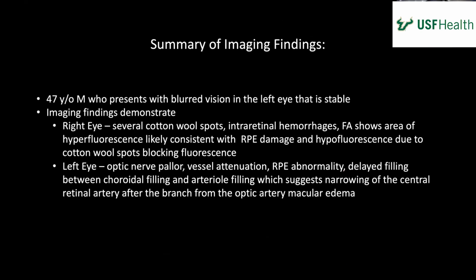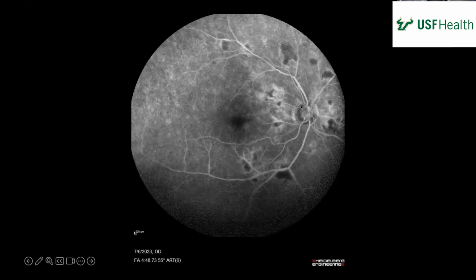You see how the nerve stays dark, not to get back to the last case. Yeah, that's a pretty normal nerve color. Your nerve's supposed to stay dark in the late phase, more or less. Yeah.